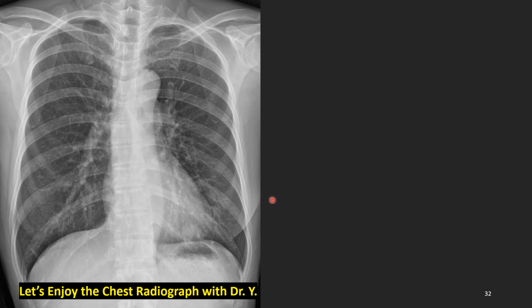Let's find out another tumor behind the heart. You got it? Yes, here it is. Her lung looks clean. She doesn't seem to be a smoker. Yes. She can have an operation here and prognosis seems to be good.